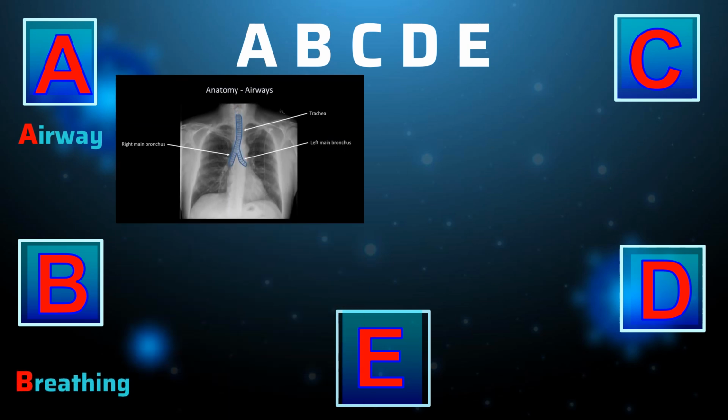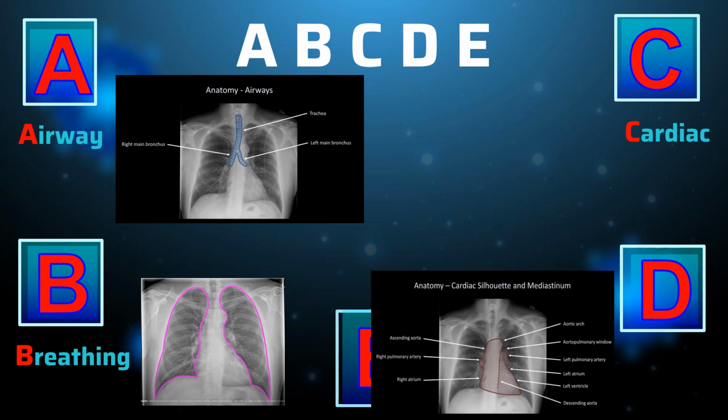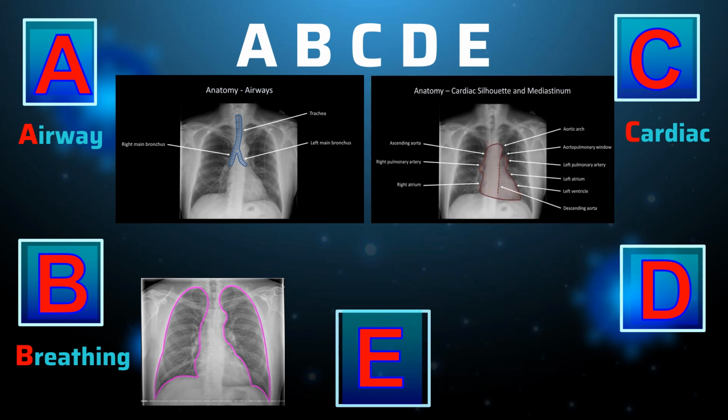B stands for breathing, which will address the actual lung fields. C stands for cardiac, which will identify and evaluate the heart and mediastinum.